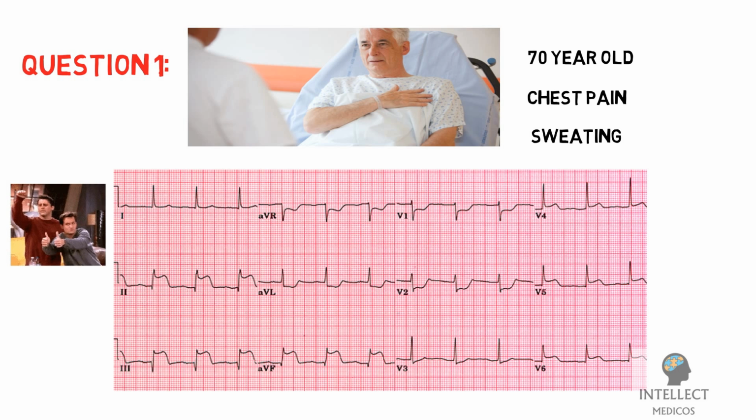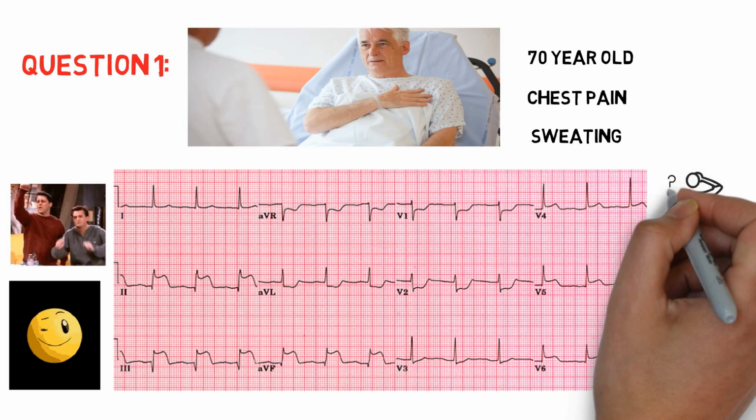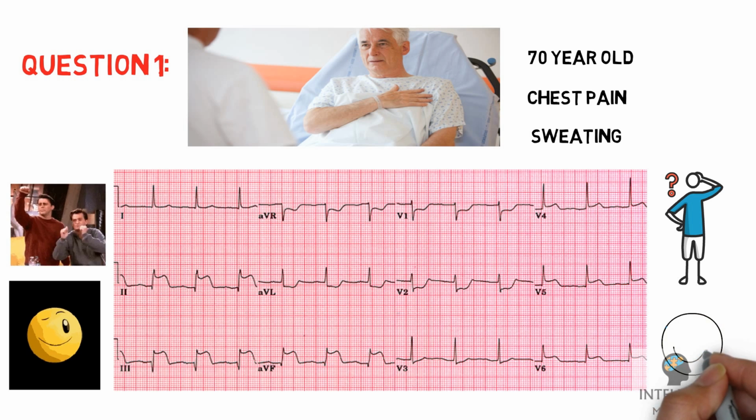If you know the answer, that's superb, amazing. We have some interesting and difficult ECGs for you guys in the later part of this video. Just wait. Whereas, if you are not able to interpret, don't worry my friend. We are here to help you out.